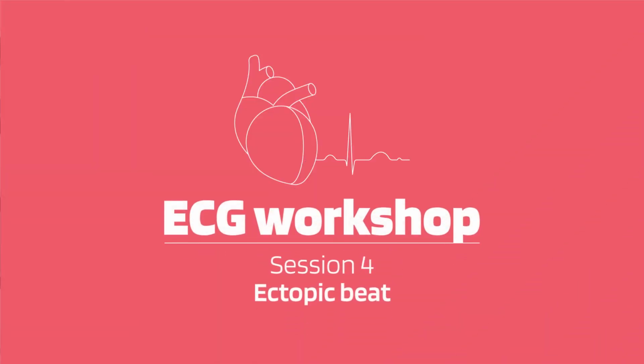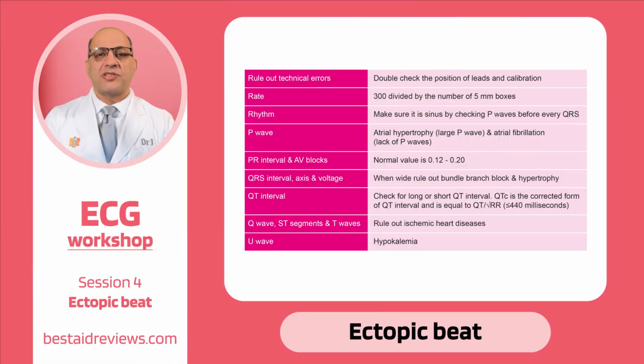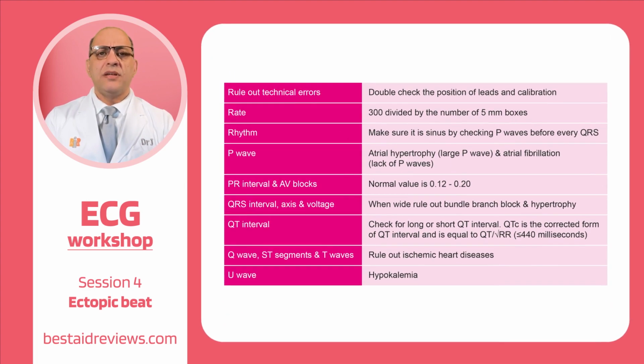This is session 4. Today we are going to discuss ectopic beats. So we can have premature atrial contraction or PAC, or we can have premature ventricular contraction, we call it PVC. So if we follow the same pattern, we have a table.